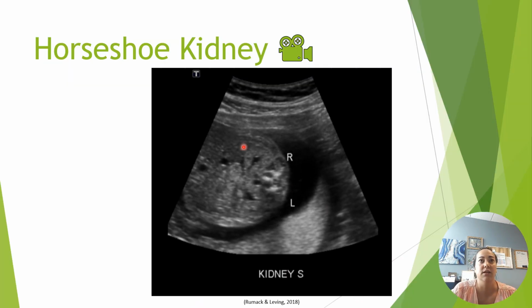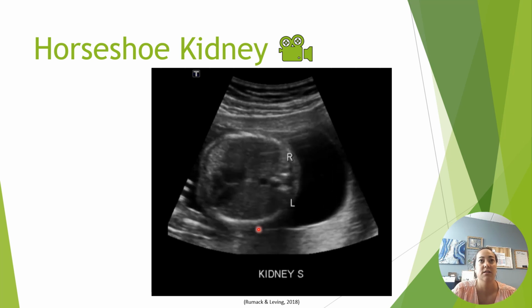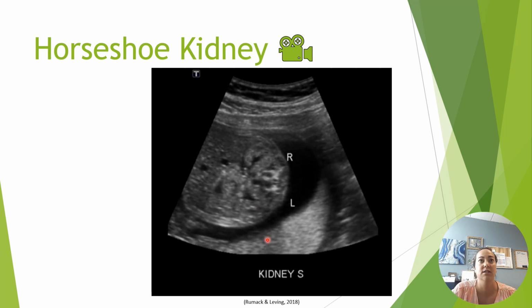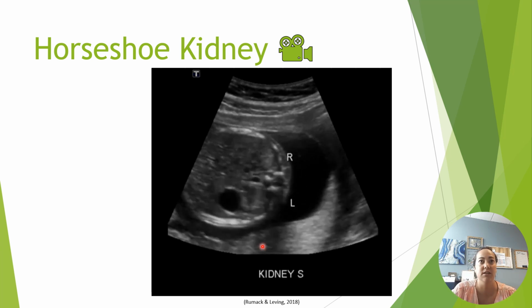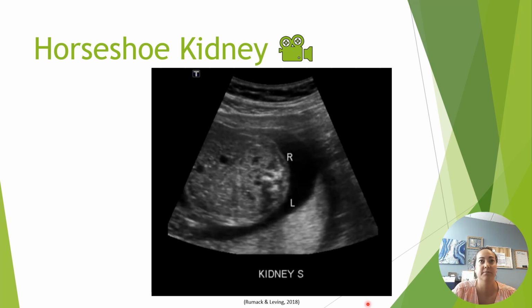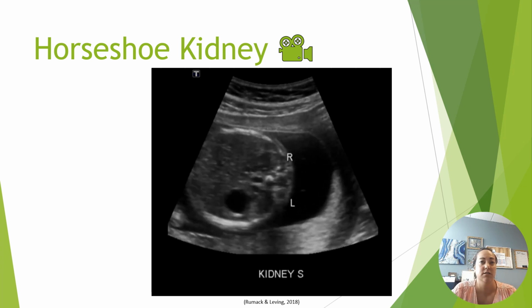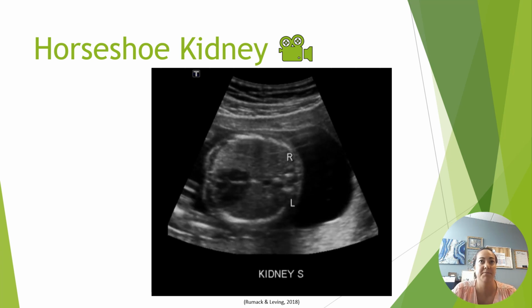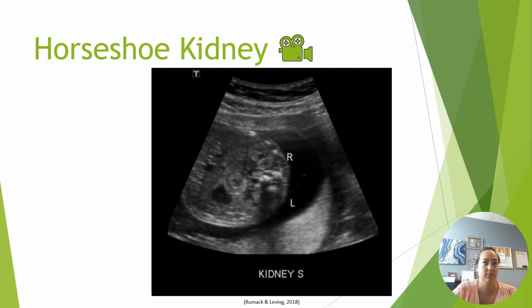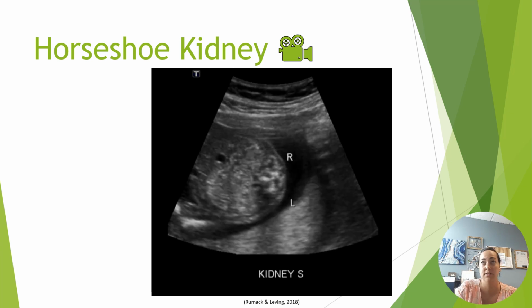Here is a video clip showing those kidneys. So that's going from inferior where they're connected there, moving superiorly, stomach and chest where they are not connected. Connected there. And let that run one more time. And then you would want to throw some calipers on those renal pelvises to see if they're normal or not.